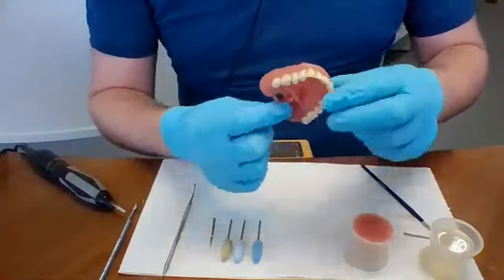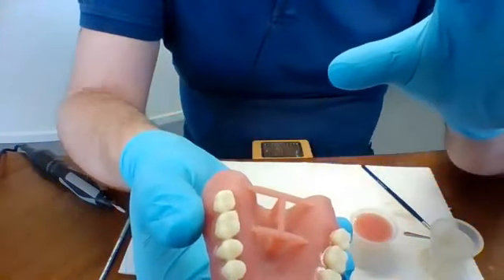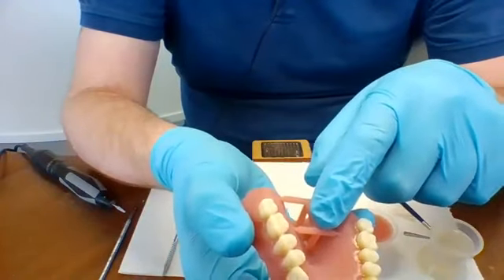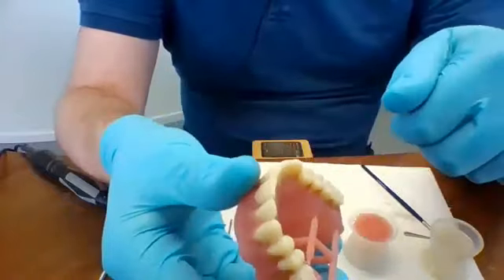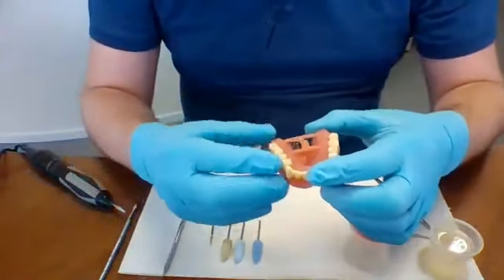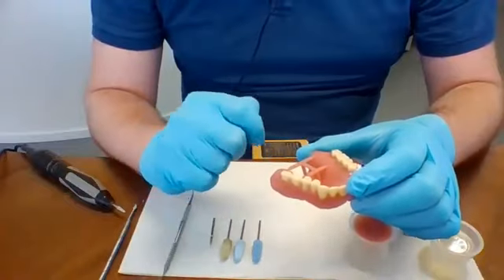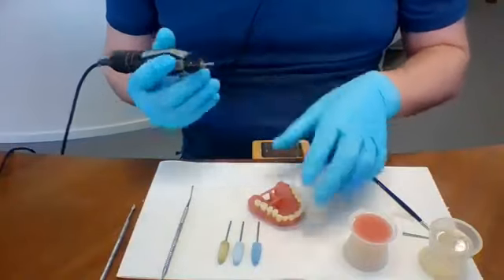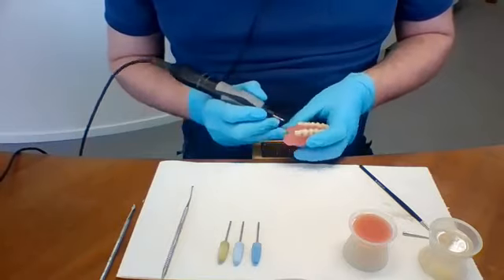And I have one here post cured as well. So this is how it looks after post curing. You can see that the support bars that were placed are still on there, but the tooth arches are now stuck in the denture base itself. So before we go to polish the denture base, what we need to do is take away all the bars that we used during the printing. So I will quickly take another tool and I will remove the bars.